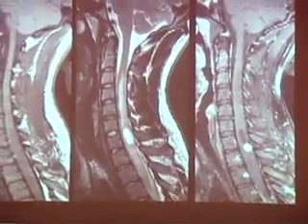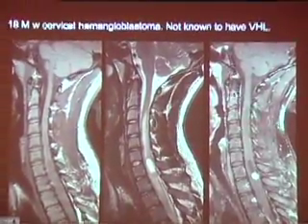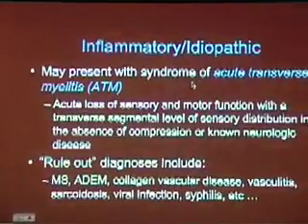This particular patient was not known to have von Hippel-Lindau, but when you do diagnose what you think is an isolated hemangioblastoma, it is important to think about that.